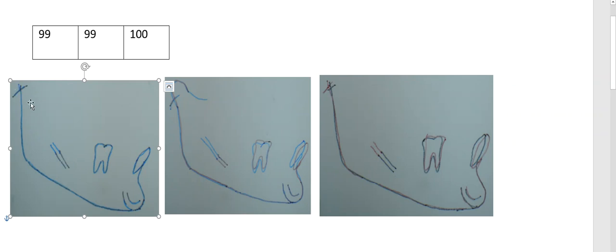I don't go for marking the condyle. In fact, the articular point is the point which I take for the superimposition to see how much change has occurred here, because the articular point is quite clear and the condyle is not so clear. Even in marking the condyle, you can have an element of bias, and this is not a stable structure, and examiners are really bothered if they see something that is articular.